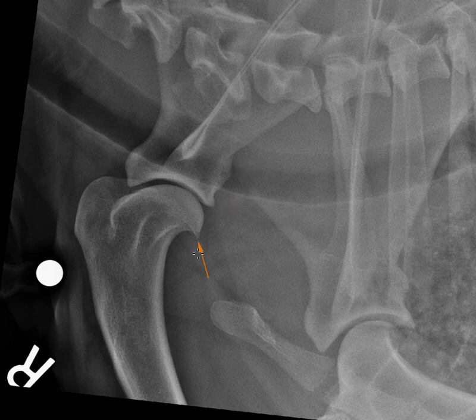When we're doing orthopedic cases and we use our ABCDs to accomplish that systematic approach, the one thing that we can miss out on is we need to make sure that we remember to look at the entire radiograph. When we're looking at the distal limb, often the entire radiograph will only include our orthopedic anatomy, and so our ABCDs get us everything we need to know. But in this case, not only do we have the right shoulder that we're interested in, we have a little bit of the left shoulder and even a little bit of the thorax.